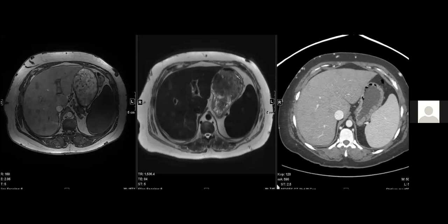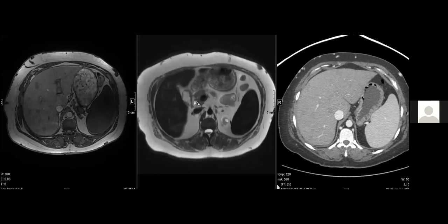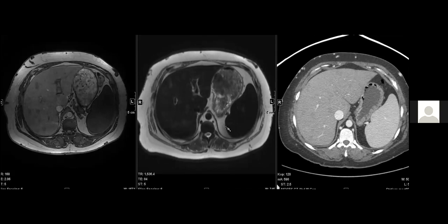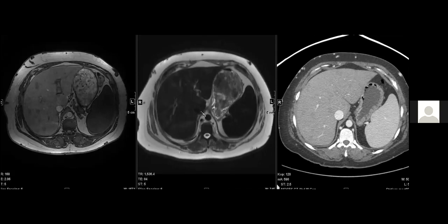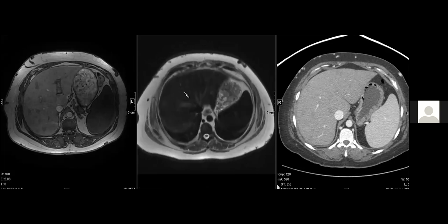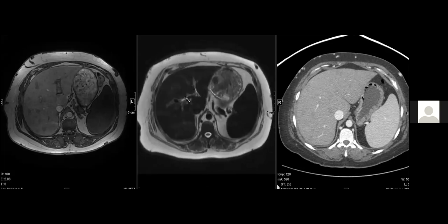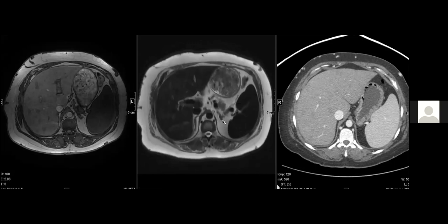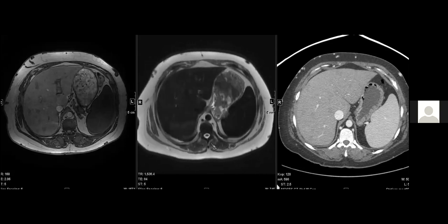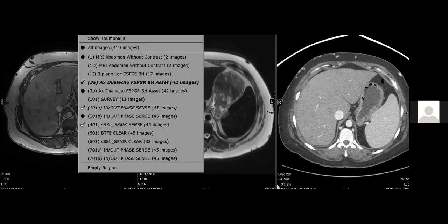So the patient came for MR. In MR, one thing you see is, this is a 3 Tesla scanner. And we see these lesions and they're slightly hyperintense, so that's concerning. But we also see that the spleen is very dark on T2, darker than the paraspinal muscle. So now we're beginning to think of iron.